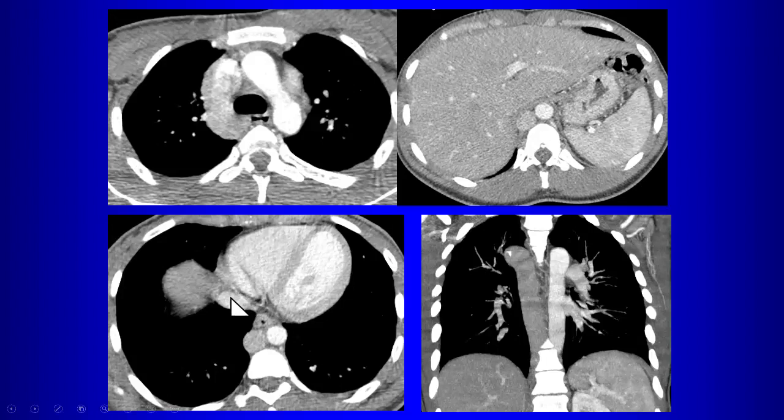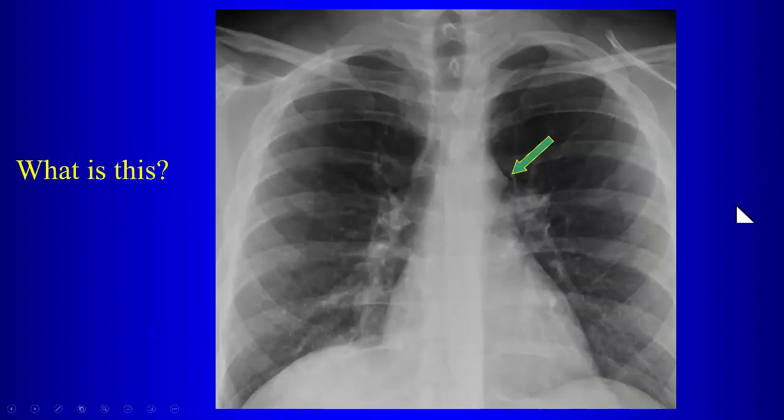See that? That's this guy over here. So the hepatic veins do form an IVC that drains to the right atrium, but the intrahepatic portion of the IVC is not there. So all of the venous return from the lower part of the body is coming up through the azygous vein here, which essentially replaces the IVC embryologically in these cases, and you get this dilated azygous arch, which we see on the chest radiograph as the dilated azygous vein.